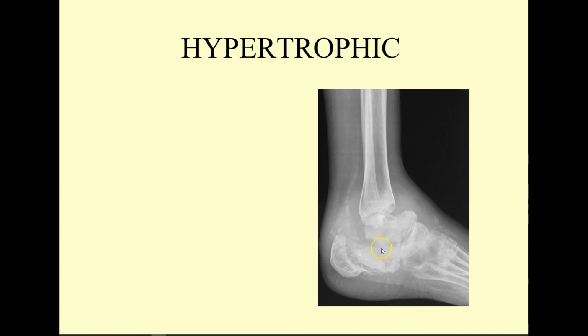So I start with the observation. I certainly see destruction here. And then I've got evidence of debris. There is so much destruction and debris that I find this to be rather disorganized.